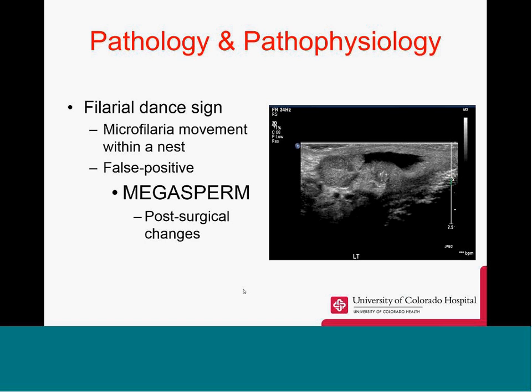On ultrasound, you'll see what's called a filarial dance sign. It's the microfilaria movement within the nest. There is a false positive. My cine doesn't work, but these little echogenic structures within the epididymis dance up and down like so. The false positive would be a megasperm.